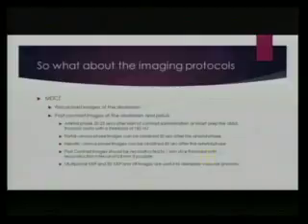And then, use of multiplanar MIP images, 3D MIPs, and volume render. Or you can get together with your surgeons and see what they like. They're all going to have their own preferences, and since they're standing there for 12 hours over the patient, I usually do what they want.